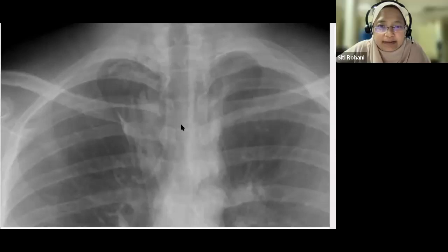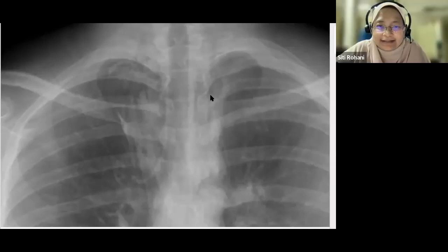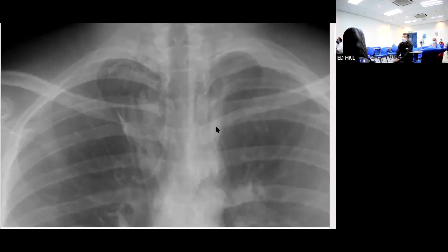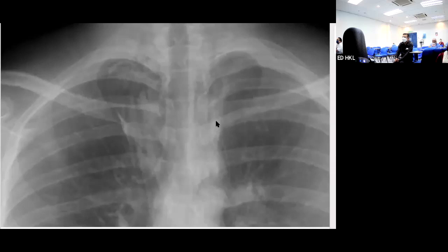Okay. Pneumothorax is when you can see air and when you can see the pleural line. The one that is the pleural line, there's a lucency. On the left side it is a little bit somewhat like that as well. In this patient, we established this is a pneumomediastinum. So if we don't see the pleural line on the left side, we don't call it a pneumothorax. Small pneumothorax. The most important is the pleural line.